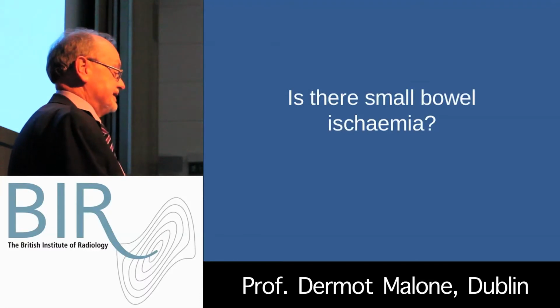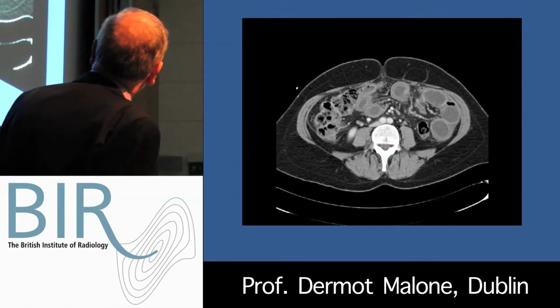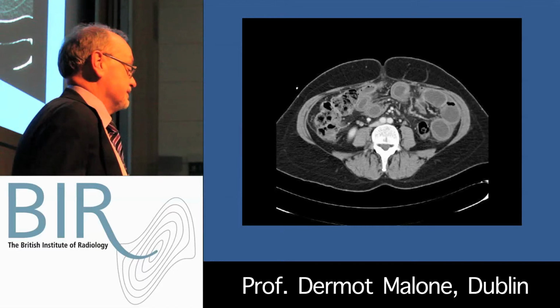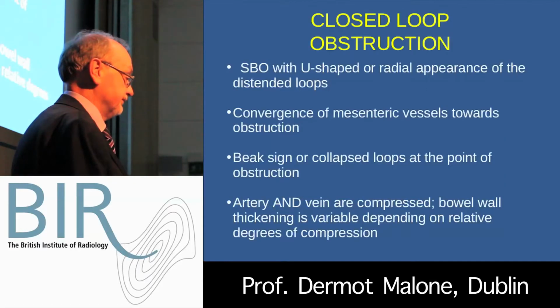We've dealt in detail with the question of ischemia of the bowel, so I won't go through all that again. What I will point out is this is a patient with small bowel obstruction, and we called mucosal edema in these loops and recommended early surgery. They operated and found relatively normal distal small bowel. Again, that doesn't mean we were wrong. This patient's small bowel was congested, and the first thing to get into trouble is the mucosa. The surgeons don't necessarily see that. I'm sure the patient benefited from releasing the obstruction.